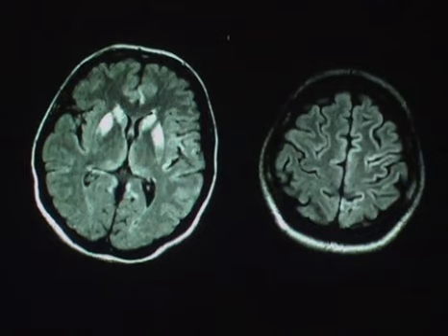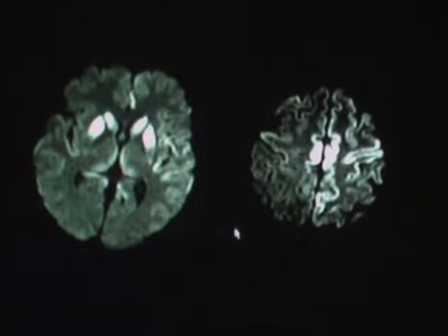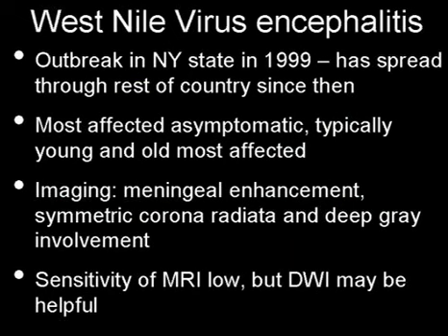Basically, there is some fairly prominent basal ganglia signal abnormality, lentiform and caudate nucleus signal abnormality, some vague signal within the thalami bilaterally, but also signal abnormalities involving portions of cortex. And on the diffusion-weighted imaging, it becomes fairly clear where the abnormalities are. But again, in some cases, these may precede the T2 signal abnormalities that we see with these lesions.